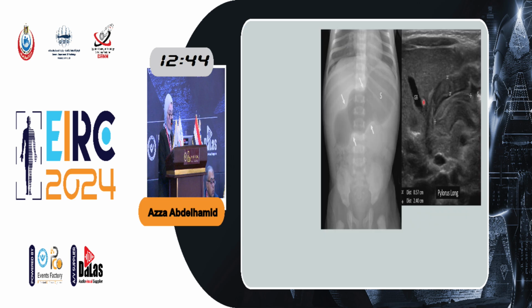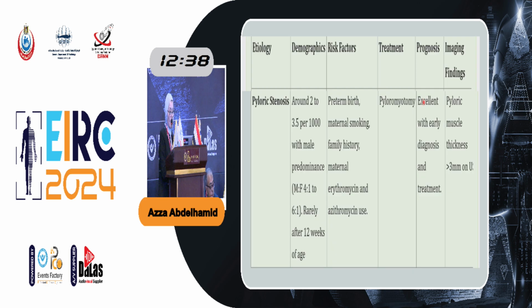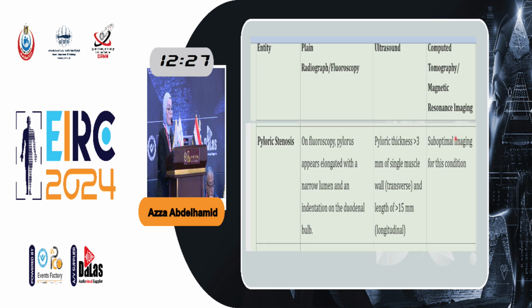This is the case presented with Dr. Hussam. I will not go through it. This is HPS. Okay, and of course, ultrasound is the modality of diagnosis. 3 millimeter and 15 millimeter are the numbers you should remember here.